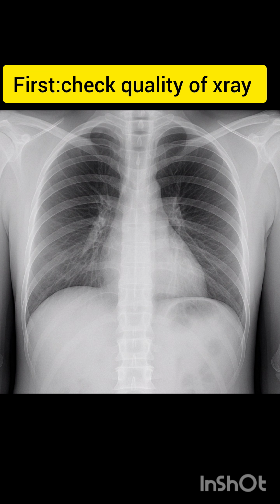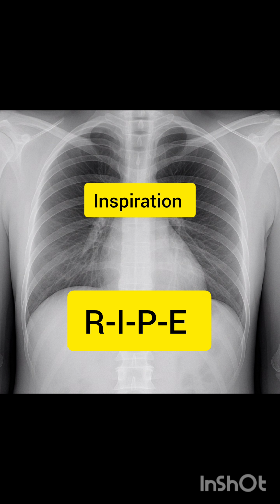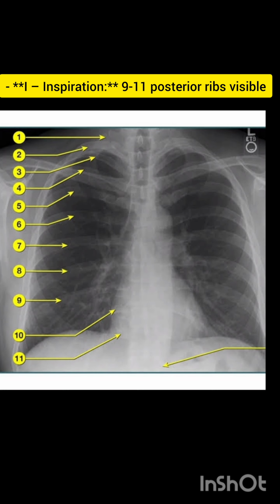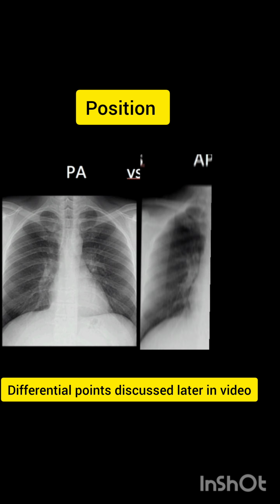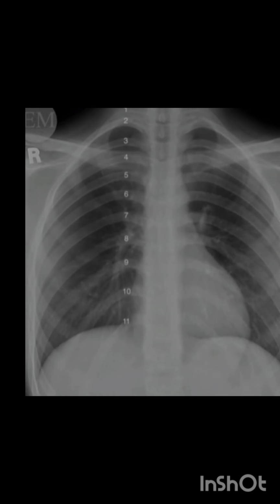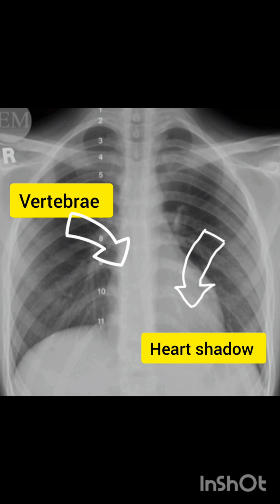Always start with quality check using the RIPE method: rotation, inspiration, position, exposure. Rotation, clavicles equal distance from spinous process. Inspiration, 9 to 11 posterior ribs visible. Position, differentiate PA versus AP chest X-ray. Exposure, in a very well exposed chest X-ray, vertebrae are seen behind the heart.